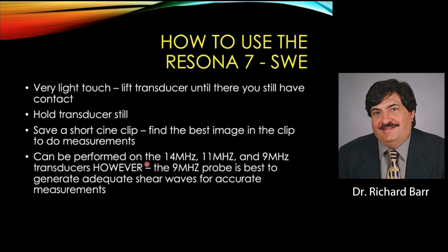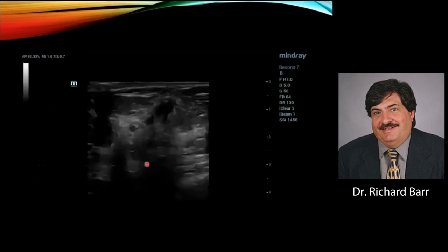It can be performed in all the transducers, but remember that the higher the frequency of the RF pulse, the more it's going to get attenuated. So if you have a very dense breast or big breast, you may run out of energy in the higher frequency transducers. The 9 should be able to work on all patients.